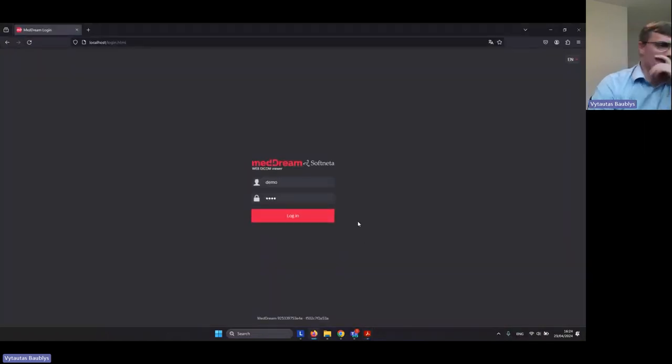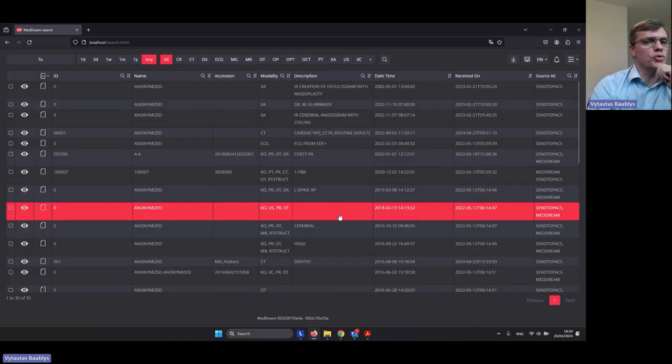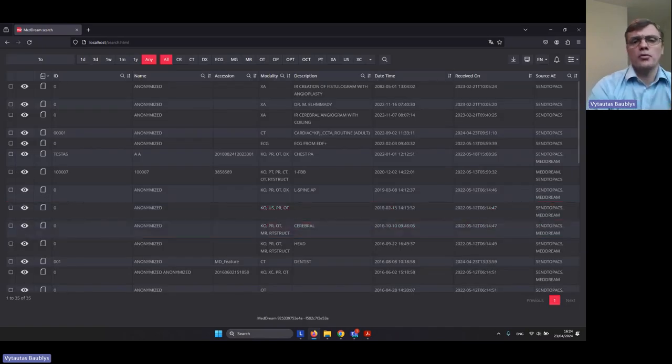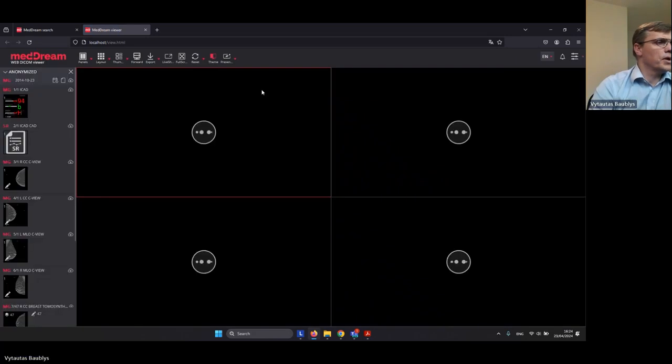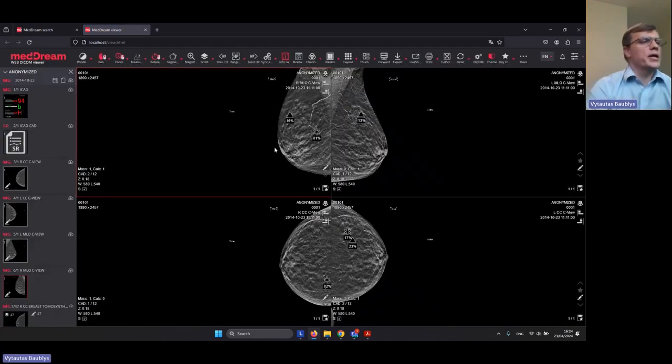I just updated my system today to the newest version, and let's go first, as I presented, to the MAMO view. So let's select MAMO. I already opened it, as would be a mistake. As you see, my MAMO is covering some patient data, covering my view. So how can I uncover it?